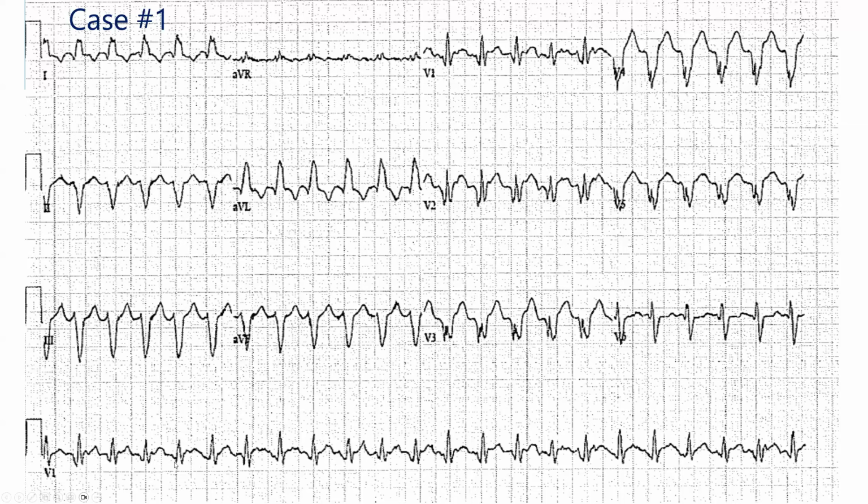the different deflections is a little bit different, but you see that there's a smooth rather than a sudden transition, right, as you go across. And I'm not seeing any sudden changes. And as you go across, you see that the QRS morphology changes in this gradual fashion.